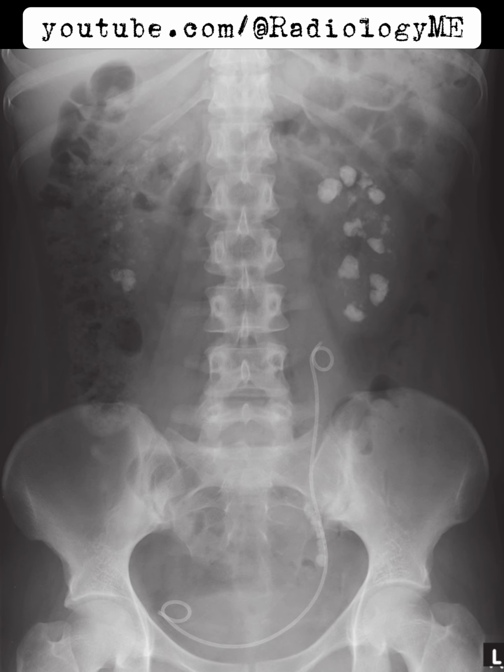If the stent migration has caused a lot of obstruction or discomfort, it might need to be addressed surgically or removed altogether. So to summarize, this case of medullary sponge kidney with migrated ureteric stent and Steinstrasse formation requires immediate discussion with the urology team, imaging follow-up with ultrasound, and likely some form of intervention for both the stones and the stent.